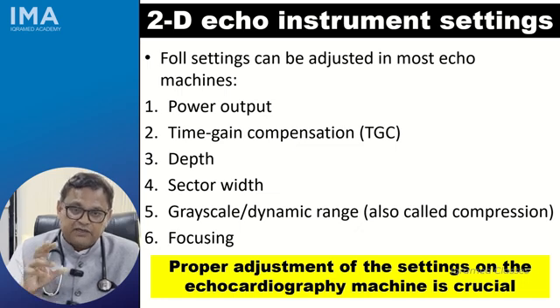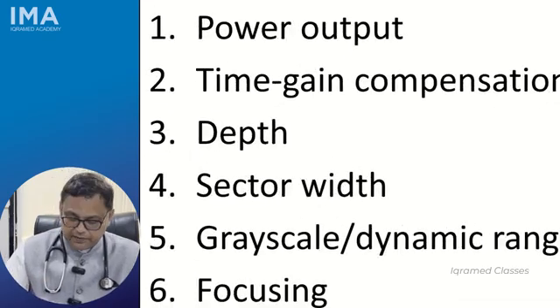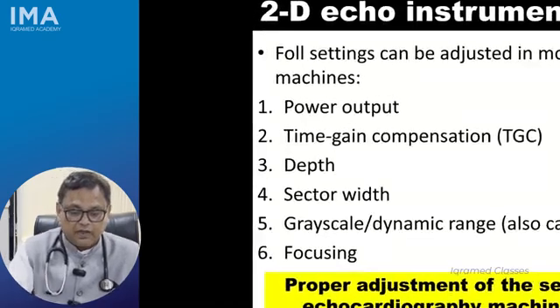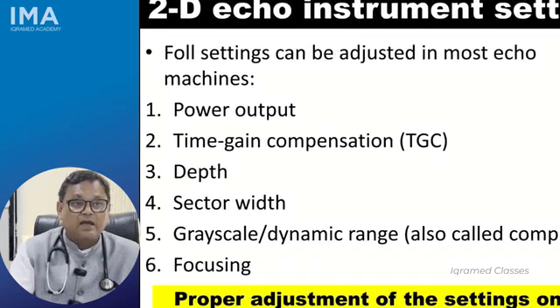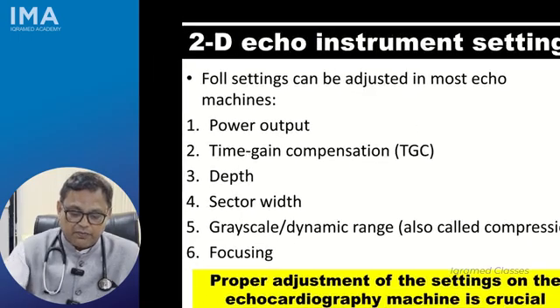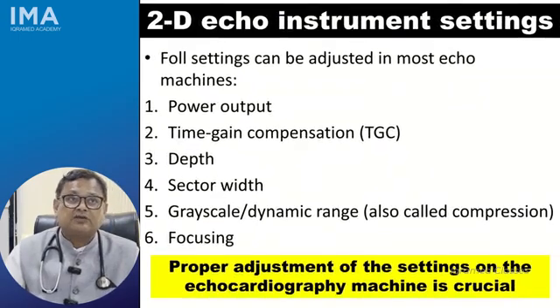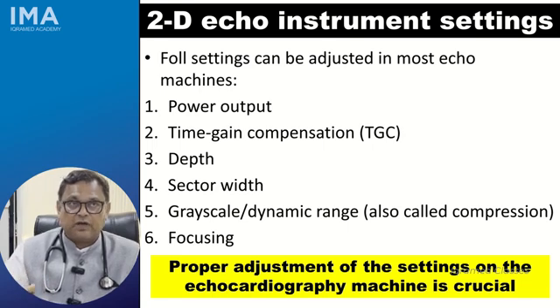If you can properly adjust the settings, then you will get a very good picture. But if you are unable to set them, then this will be a problem, and you might get a poor quality image, and you may not be able to make the diagnosis. So the important thing is to know these settings, and I will again show you these settings because this is very important.